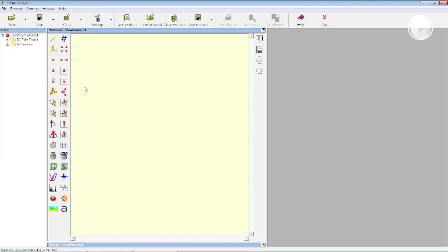over just 1 dimension. And what is important is to always know which is the output of my processing. So if my processing leads a point to become a velocity, I'm not going to have a look to these tools, but I'm going to have a look at velocity tools, okay? So we need to be focused on the fact that we need to know how many dimensions we want to consider, which is of course the topic of my analysis, and what is going to be the output of my processing.